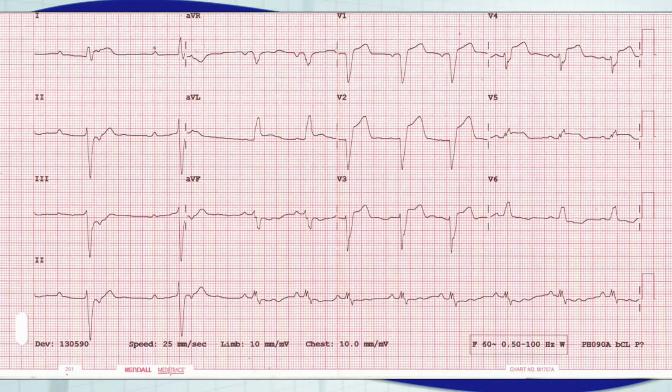So let's look at a 12 lead here and let's apply this Sgarbossa's criteria. We can ignore the rhythm for what we're doing. We're just identifying ST segment changes. We notice that we have a left bundle branch block pattern. So we want to apply this rule. We do have a supraventricular rhythm, and we want to look for concordant changes and discordant changes. What we see in these inferior leads is a concordant ST segment depression. Now this isn't V1, V2, V3, so we're not going to apply the rule here. However, I will tell you that is a sign of a reciprocal change. And the leads that it would be reciprocal to would be these high lateral leads. So let's look at those.